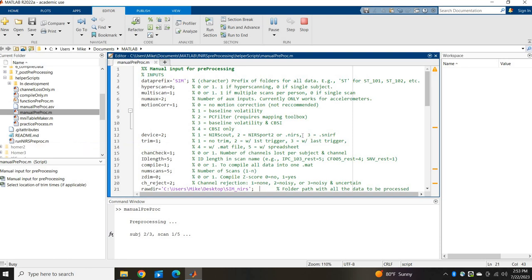The reason why I've done this is that oftentimes when people are new to this pipeline, they'll run into a lot of errors because they don't necessarily understand what each of the pop-ups is exactly asking. I've tried to add as many comments as possible and make these videos so it's clear, but you can still run into some errors just because maybe you're entering something wrong, and this might be a little bit easier instead of having to continually answer those pop-ups, is to just subtly change some of these manual inputs.